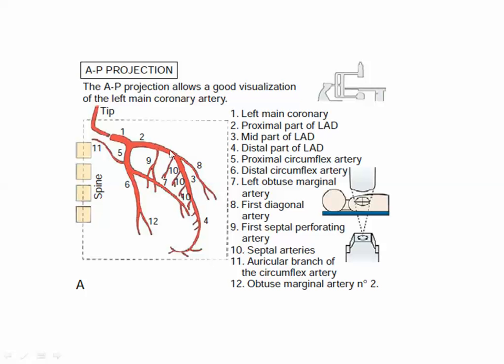So this is LAD. What is this? Diagonal. And what are these? Septal perforators. This is LCX, and this is what? OM.